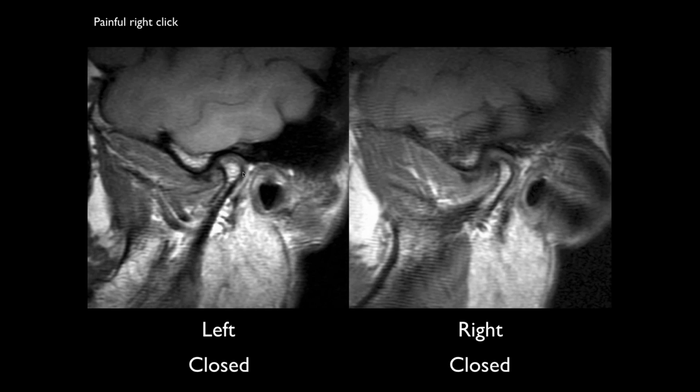I guess chronic subluxation maybe. So you have tears of the posterior attachments, right? There's no space up here. The bones, it's bone-on-bone articulation. So those posterior attachments are actually torn bilaterally, and we have anterior displacement of the temporomandibular joint disc. And this is the primary diagnosis we were looking for when we did MR scans of the temporomandibular joints, and people still do these studies.